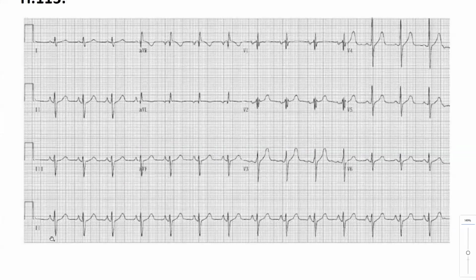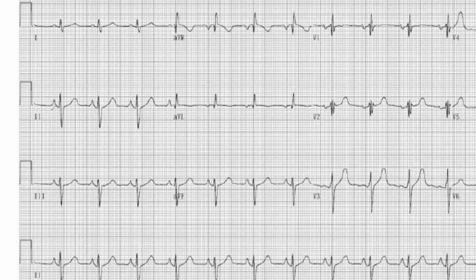There is a P wave. Yes, we do have P, positive in lead number 2, negative in AVR. So that means it's coming from the SA node. Very good. Now let's look at the morphology of the P wave. This is not wide, that's narrow. However, it's tall.